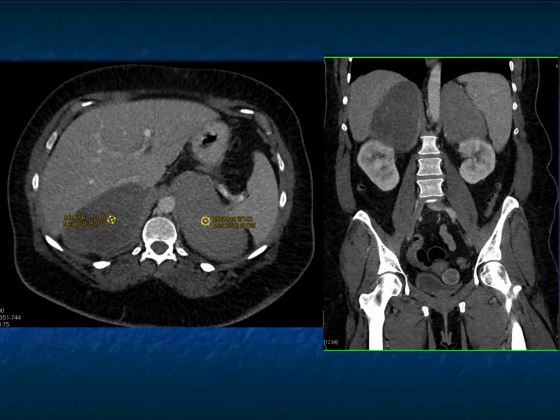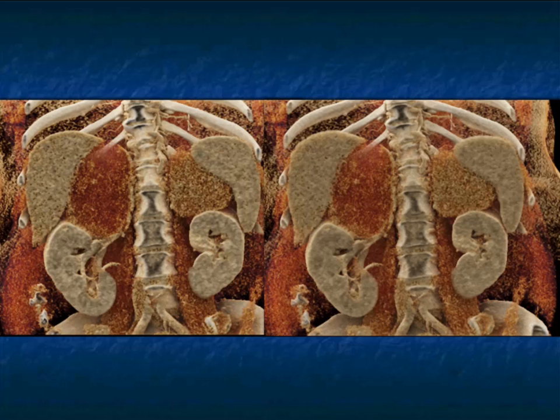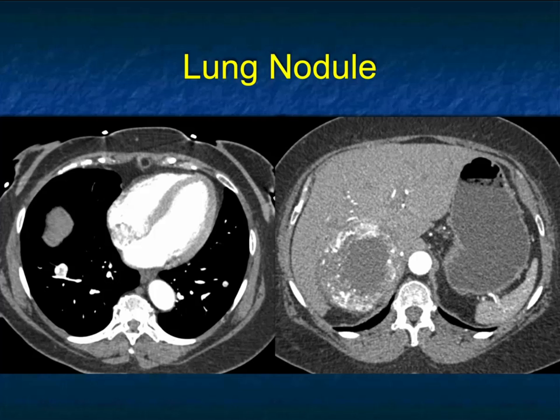And in the coronal view, the fact it kind of maintains the adrenal shape, kind of triangular here, is a really good diagnosis for saying it's primary adrenal lymphoma. And here it's interesting, you can see it on the films, but here as well, there's a difference in the degree of decreased attenuation between the right and left adrenal gland, nicely shown also on the coronal views.